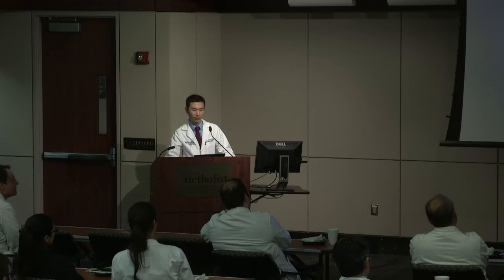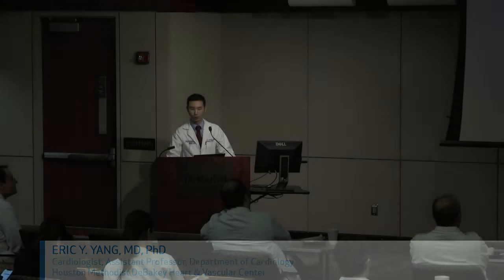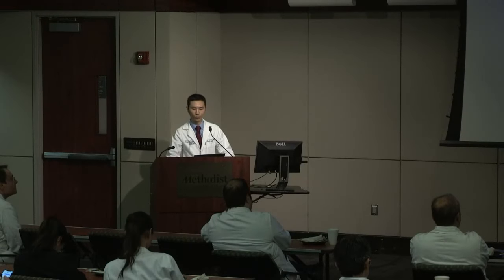What we typically do is we acquire our normal short axis stacks, go through, get our LV stacks as well. And then the nice thing about cardiac MRI, and CT can also do this, but at the cost of additional radiation and the need for contrast, we can also get 3-chamber RV, 2-chamber RVs, and RVOT views as well.